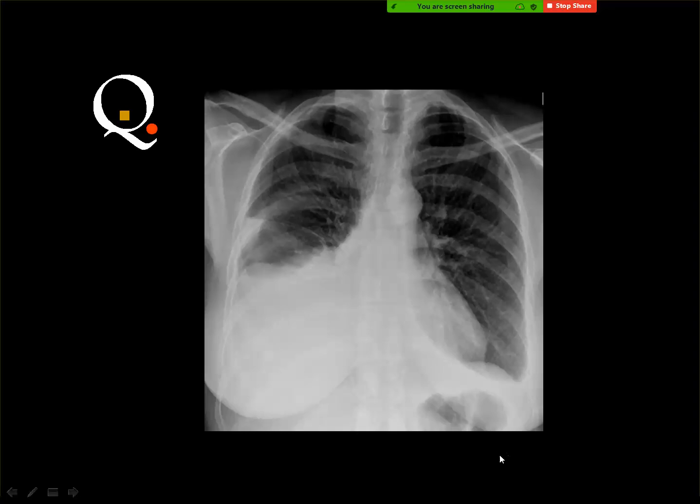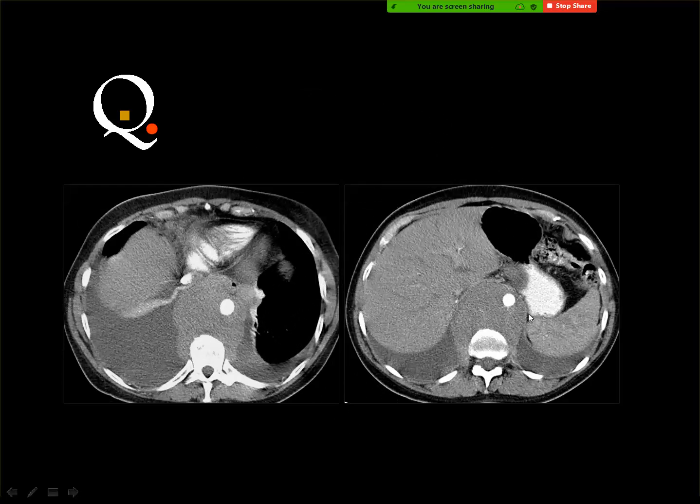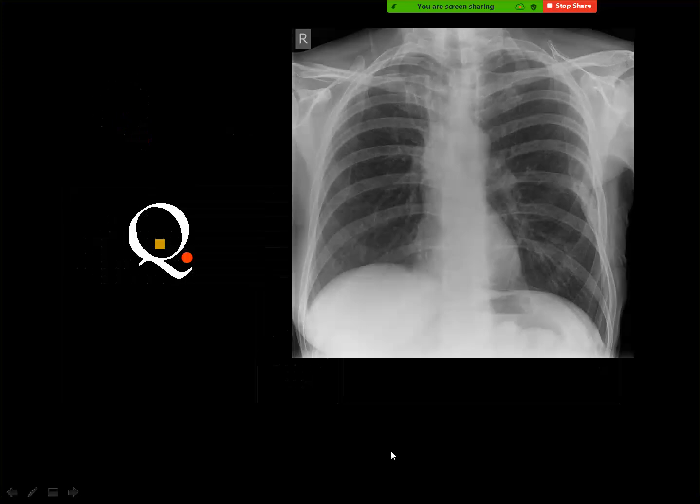Pleural effusion, the right lung. There is a mass outside. Another effusion here, but if you look carefully at the surface of the effusion, it is not the crescent sign. It is associated with the mass upward. Then you suspect that there is a mass underneath the effusion, and you got a mass, and this mass is big. It's lymphoma. Yes, Non-Hodgkin. The aorta, the floating vessel sign, pleural effusion, and this was proved to be a follicular lymphoma. Very good.